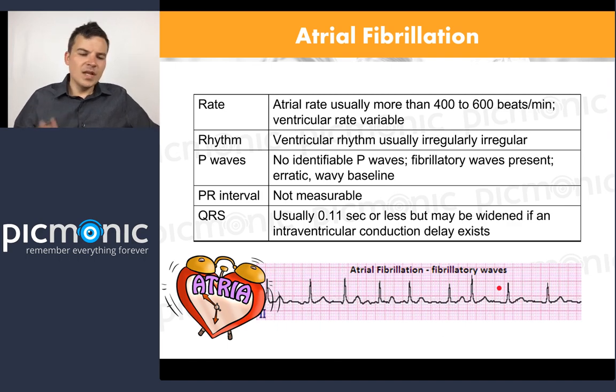What's the rhythm? Well, get your beautiful thumbs out and take a look. Well, it's wide, then it's short, then it's wider, then it's shorter, then it's wide, then it's really short, then it's wider, then it's really wide. It's not doing the same thing. There's no distance between any of these that is the same. Well, why would that distance be changing?